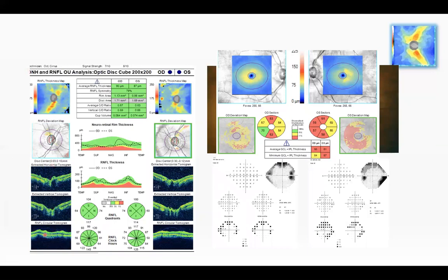You see here, I don't know if you can see it completely, but there are vitreoretinal interactions causing RNFL to look thicker than normal. The same thing happens when there is uveitis. When the uveitis is active, you have RNFL edema, and you see the RNFL very thick.